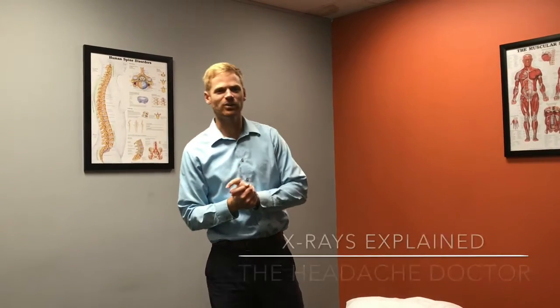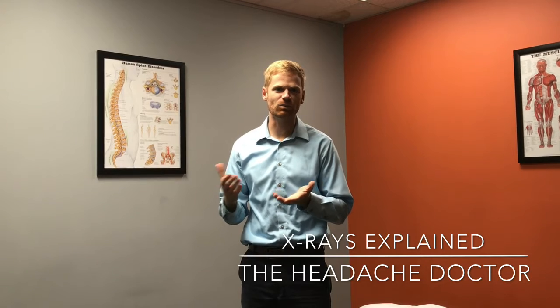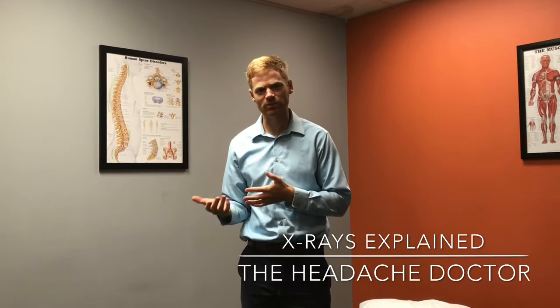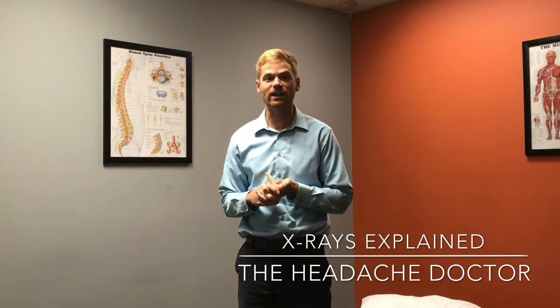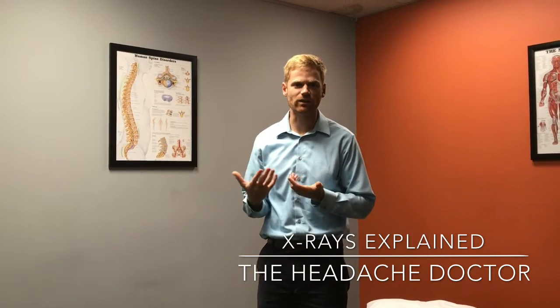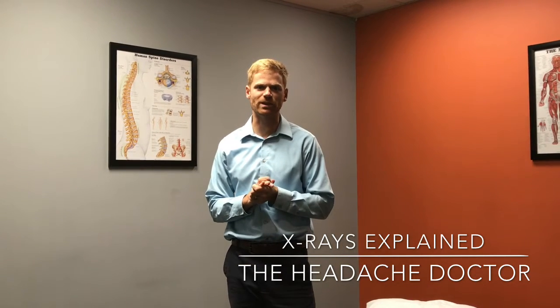Hey guys, so I'm going to talk really quick about why we have all these images and what we're finding in the cervical spine. If you're someone that suffers with headaches or you have neck pain, maybe you've gone to the doctor and had an x-ray done. Typically what they'll find is that your mid to lower cervical can have some wear and tear to it. Now let me explain this from a physical therapist perspective.